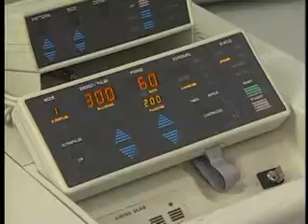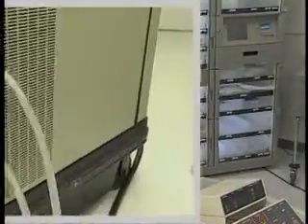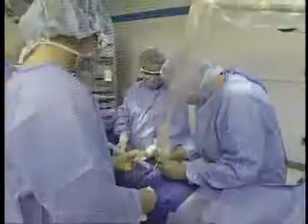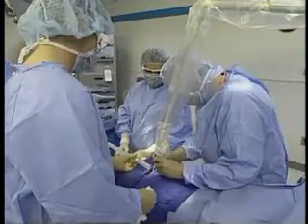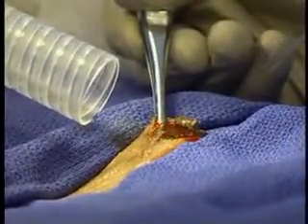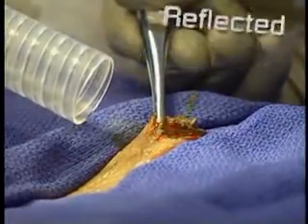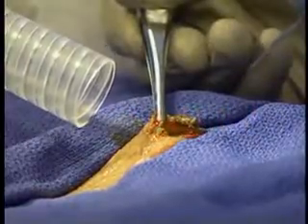There are 4 possible interactions between laser energy and tissue. The energy is absorbed, reflected, scattered, or transmitted through the tissue. The primary reaction depends on the wavelength generated and the absorption properties of the tissue with which it interacts. The tissue responses to beam interaction are thermal, photodisruptive, or photochemical. Approximately 80% of the lasers used in surgery create some thermal effect.